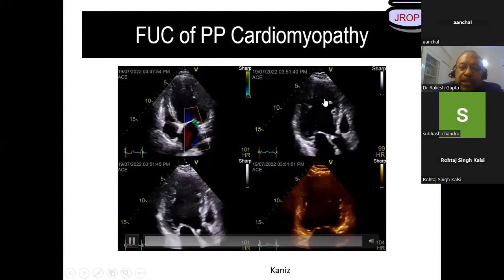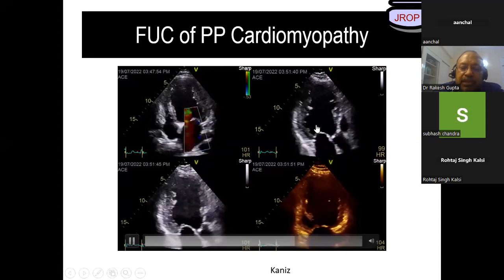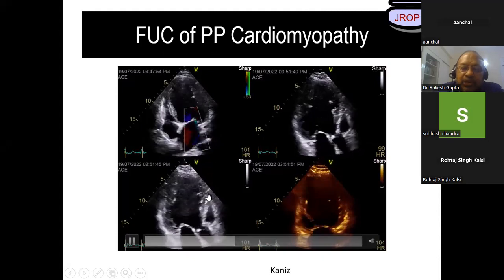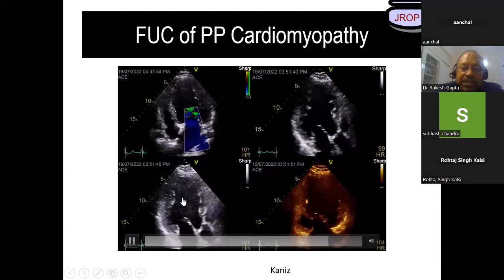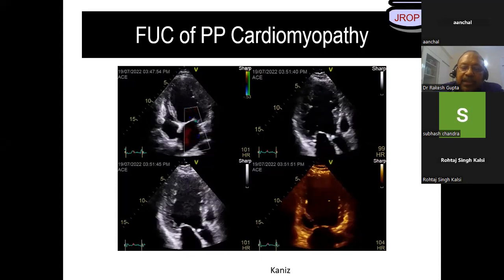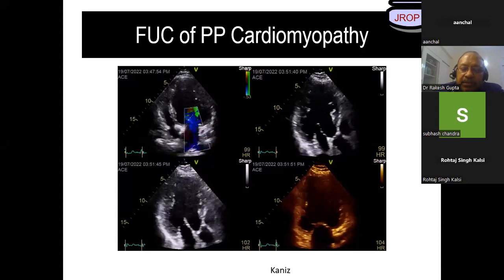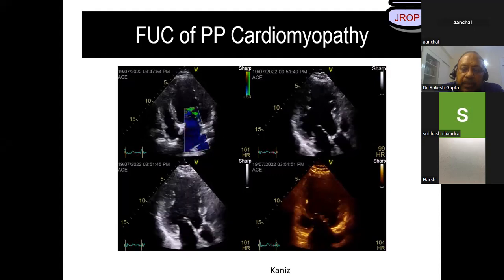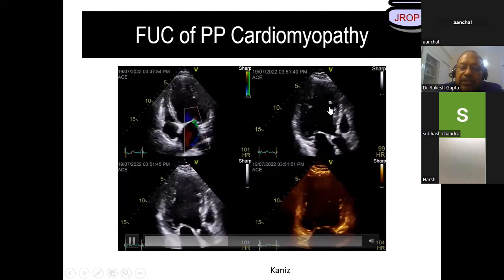I'm afraid you just can't copy. This is a mirror image of the same patient, just kept over here and here. I've just increased the zoom and the 2D gains. Nothing more than that I've done in this patient. You can't replicate the answer of this image.